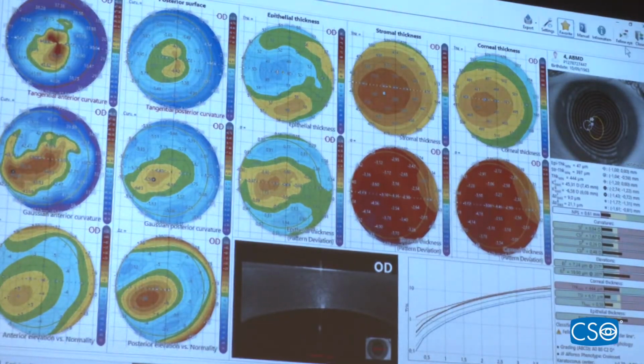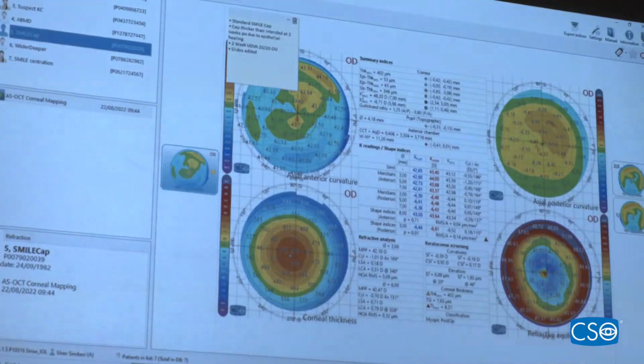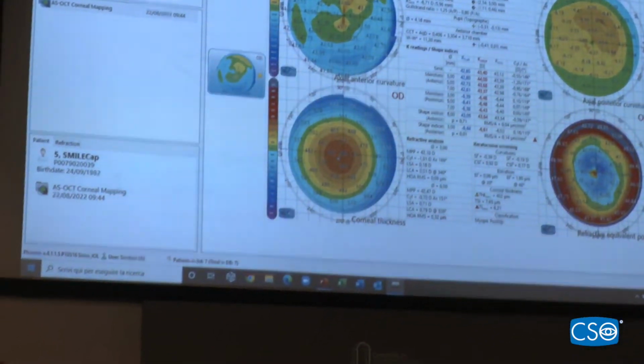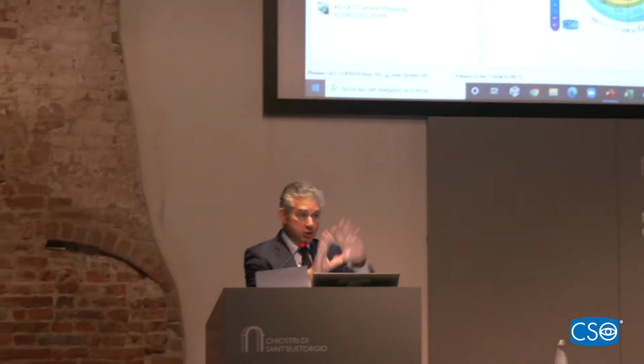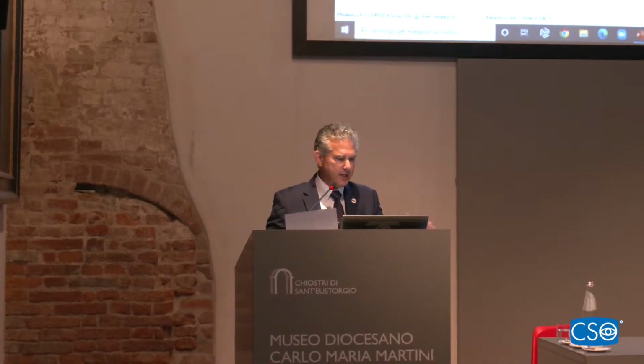Okay, we're going to leave that. So this is kind of the keratoconus windy road that we're going through. Obviously, it would be nice if we had some kind of artificial intelligence assisted way of looking at what I'm looking at right now, that could be machine learned, and then we could have a parameter around that, but we're not there yet.